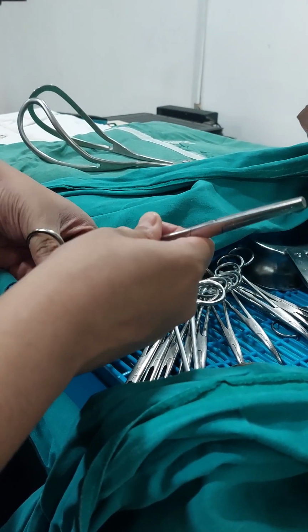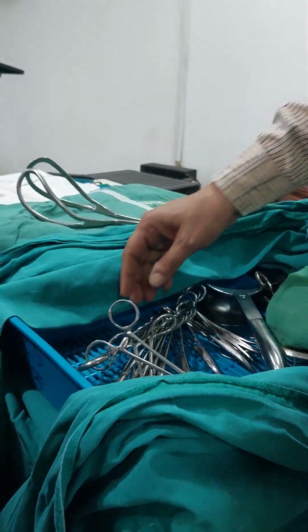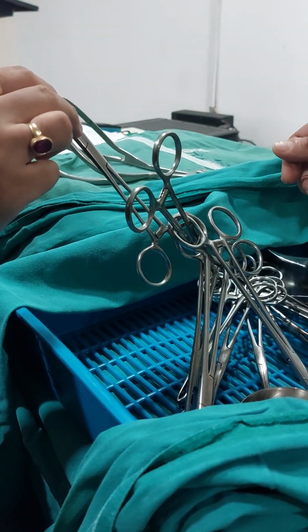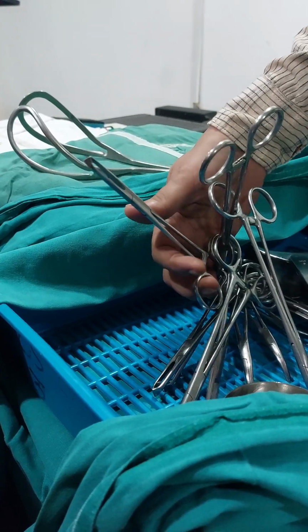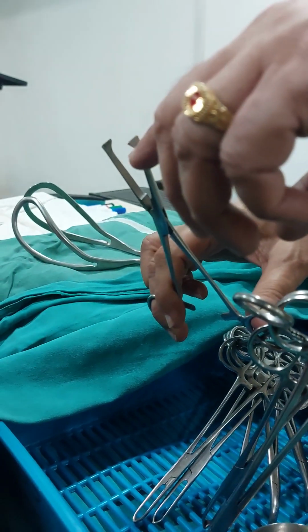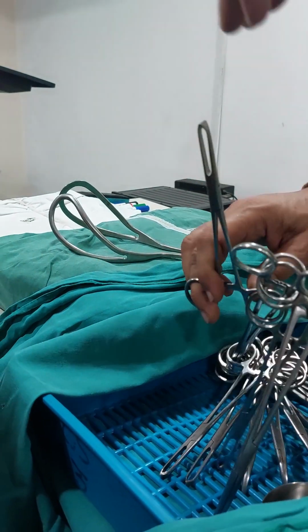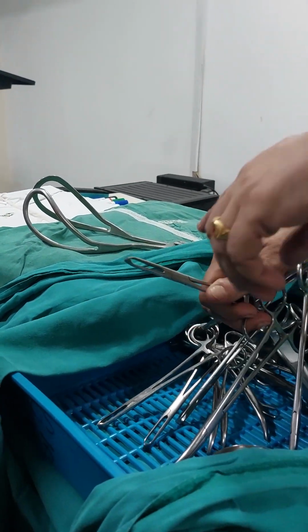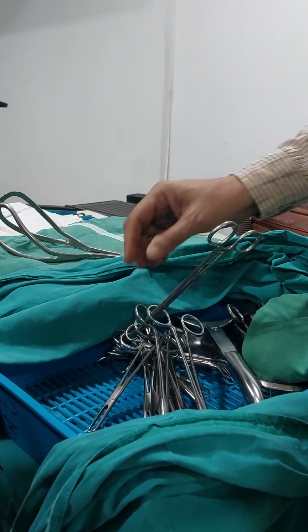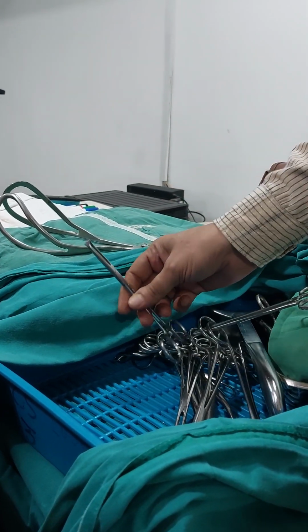It can also be used on tough structures like the rectus sheath if you want to hold it, but normally it is not used. Okay. This is what? This is Allis tissue forceps. You see the teeth, serrated margin also. The Vulsellum also has a similar type of teeth, but the Vulsellum has a curvature. I'll show you that. This is a straight one, called Allis tissue forceps. This is used for holding tissue in tough structures, like the rectus sheath, skin, vault of the vagina or vaginal tissue.